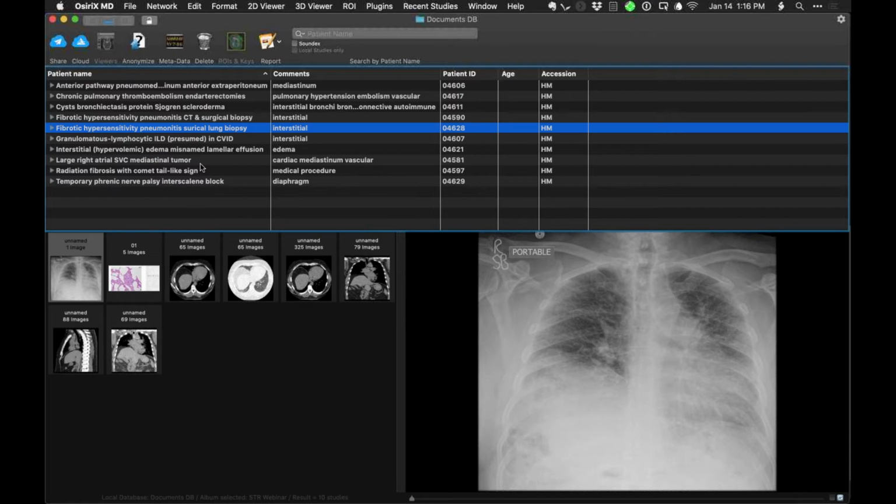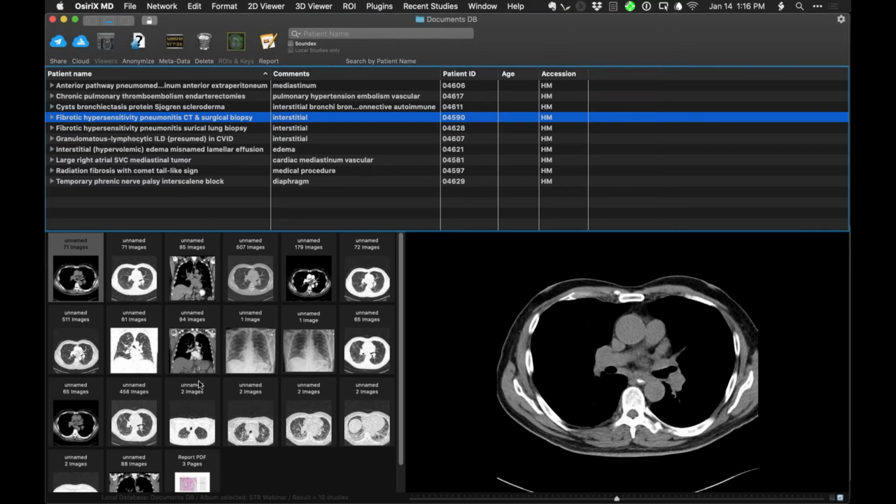And that's it. So this patient was labeled under the microscope as fibrotic HP. Okay, I'll stop there for the time being. I have some other cases, but I can show them later or another time, Jeff.